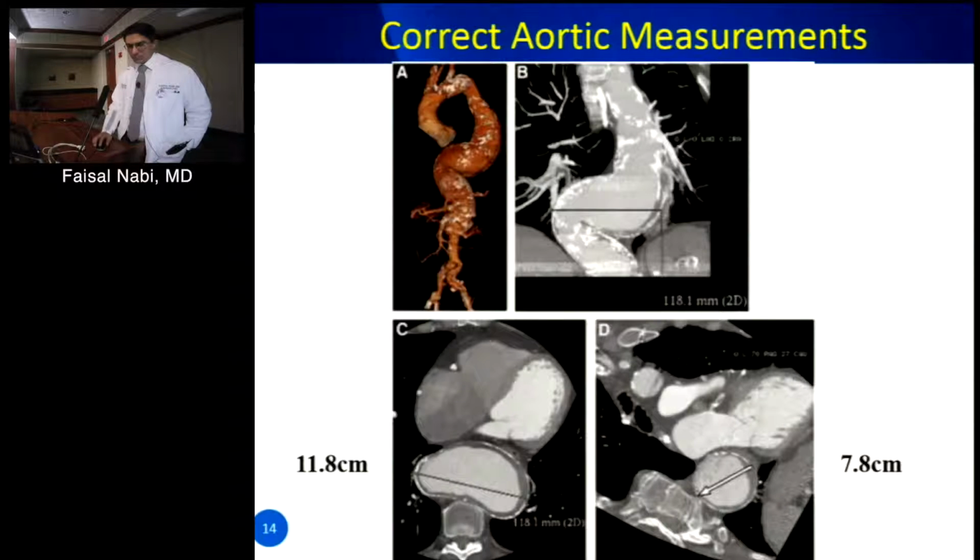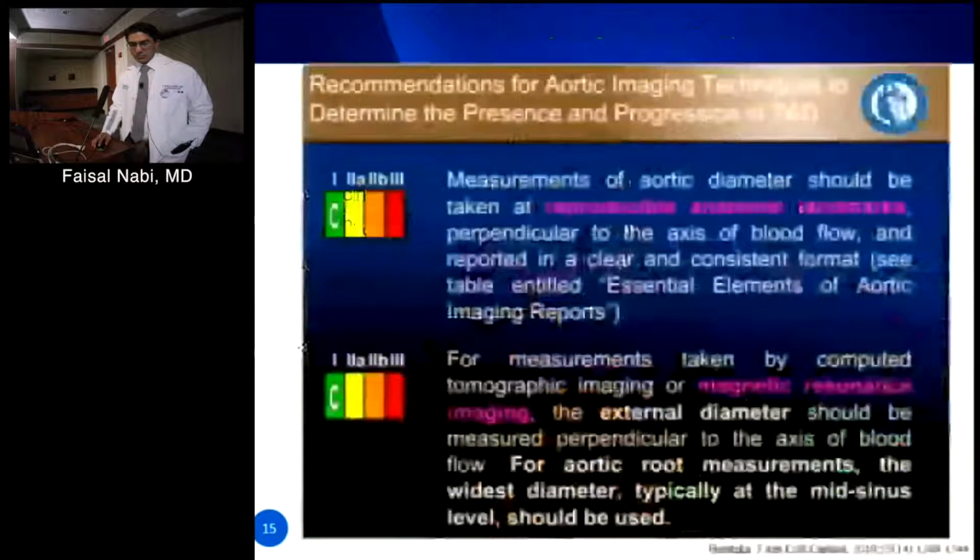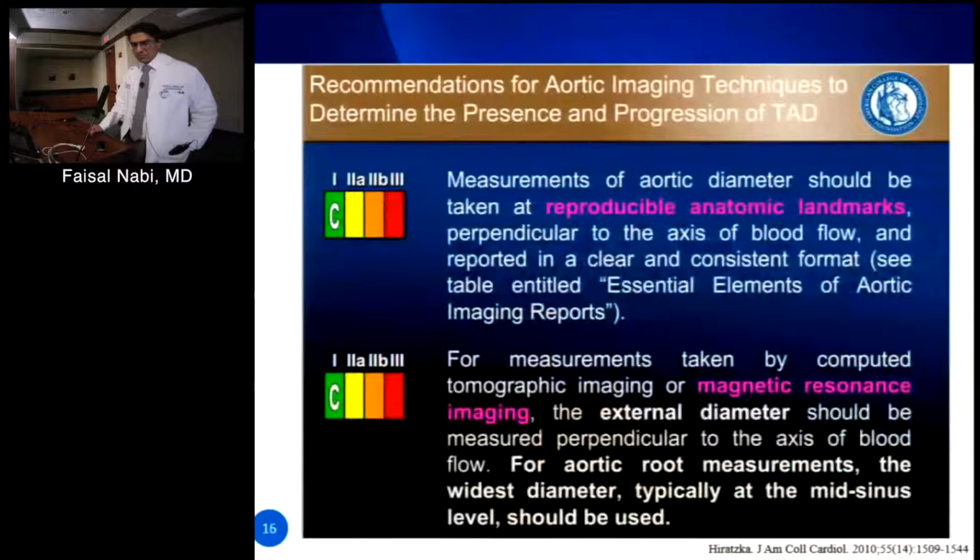The trailing edge is the most difficult. That's why you go leading edge to leading edge, bypassing this issue, and you still underestimate by the thickness of the posterior aorta. Or you go inner to inner, and obviously you make it even worse. For clinical decision making, you'll get an even smaller measurement.